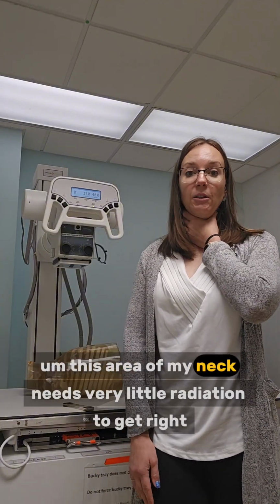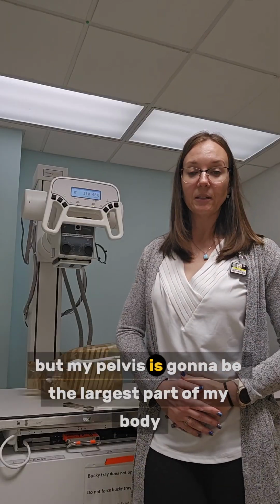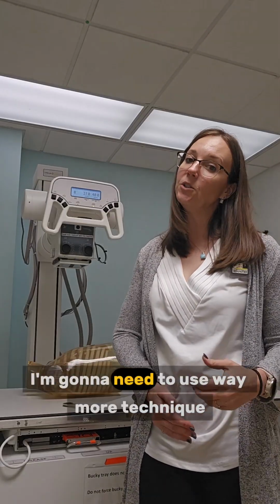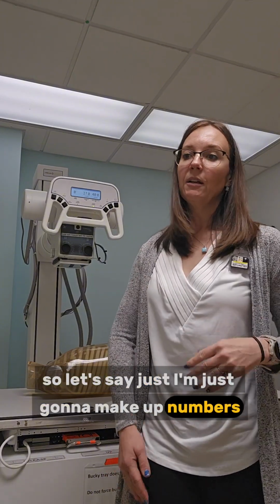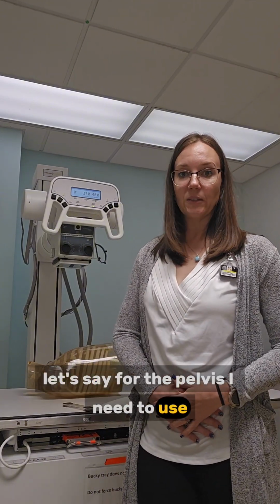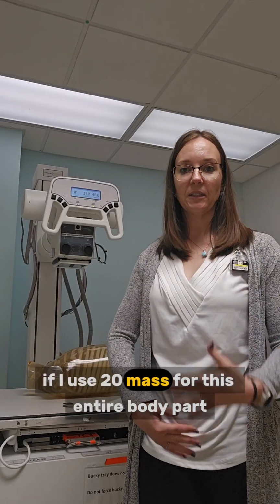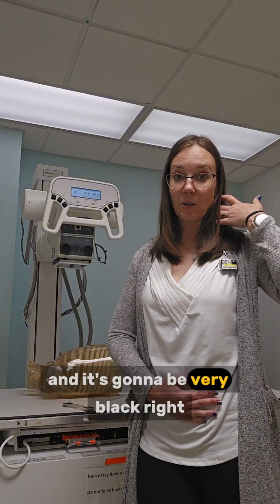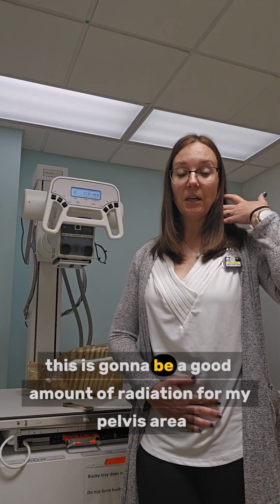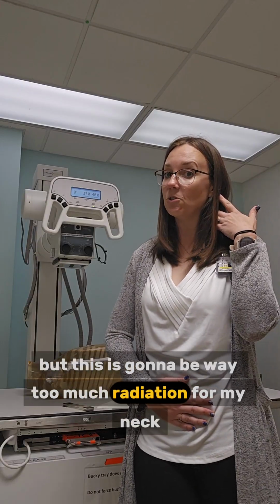this area of my neck needs very little radiation, right? But my pelvis is going to be the largest part of my body. I'm going to need to use way more technique. So let's say, I'm just going to make up numbers, for the pelvis I need to use, say, 20 mAs, but up here I only need to use 5 mAs. If I use 20 mAs for this entire body part, this is going to get super fried out and it's going to be very black, right? This is going to be a good amount of radiation for my pelvis area, but this is going to be way too much radiation for my neck.